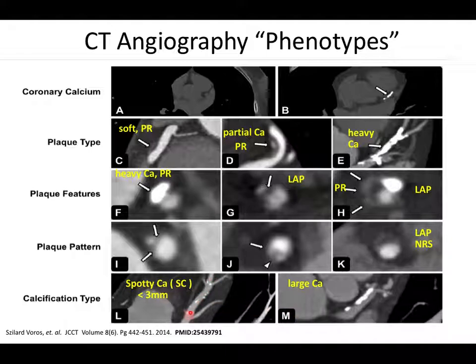You can see also a very different structure of calcium in some vessels, where you get a nice linear plaque here versus all of this particulate calcium that's obviously different lesions being repaired. So that's in the future, when we get to higher resolution CT and very good motion artifact correction, we'll be able to make these phenotypical images of individual plaques. That's where it's going. Okay, I'm going to stop there, and Thursday we'll do CT applications, and in the last 20 minutes we'll do the presentation.